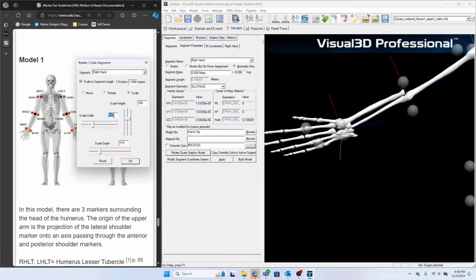So what I found earlier is 125 in all directions makes the most sense and is actually very similar to my hand's geometry. So you feel free to choose a number that makes sense visually for your situation, for your case. You might go larger or smaller.